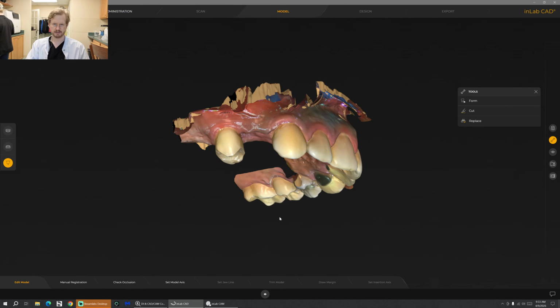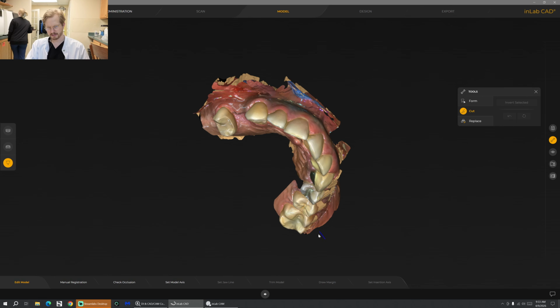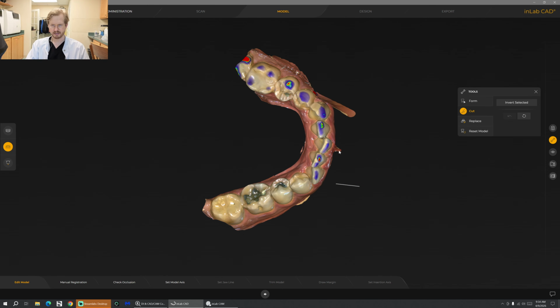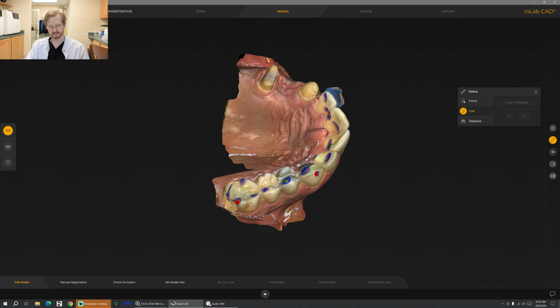It looked like this. So we see the patient's missing a tooth. She did not want an implant. And so she has elected for a bridge. This is where we come in. Trim the opposing. Her bite is not great, but we've got a pre-op image. So anything we make, we can make it live within that old framework of what she's used to.